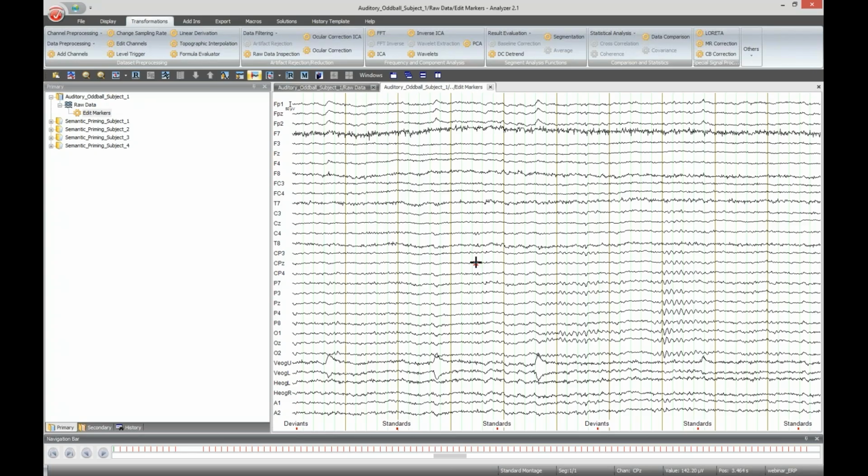Okay, this is a very short data set, of course. Visual inspection is therefore very quick. However, I would recommend to always do this also for longer data sets, as your expert eye is invaluable to evaluate the quality of your data.